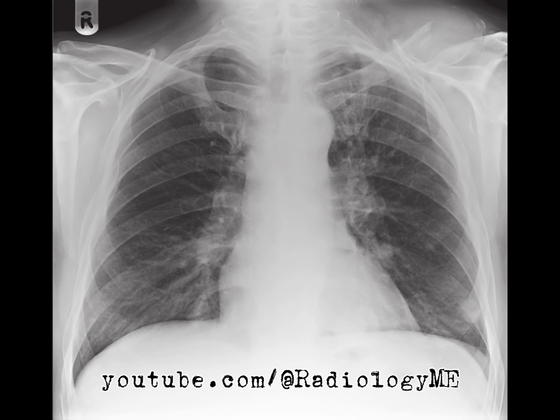Next, they might ask, why do you think the clavicle is involved here? I'd say the distal clavicle is a common site for metastatic spread, especially in cancers like bladder, breast, and lung cancer. The osteolytic nature of the destruction, combined with the pulmonary nodules, makes metastasis far more likely than a benign process like osteomyelitis or trauma.